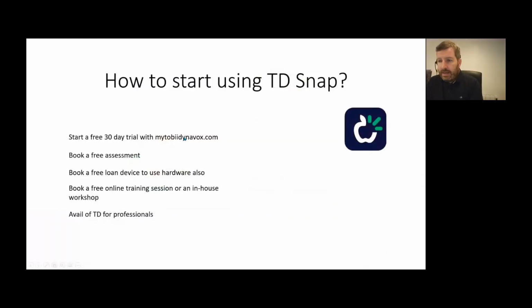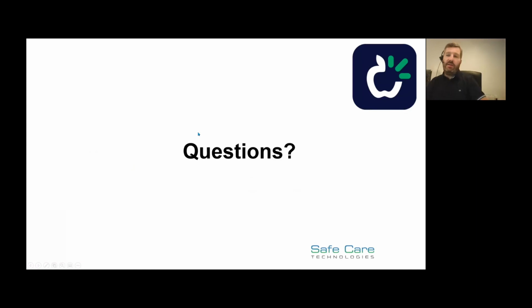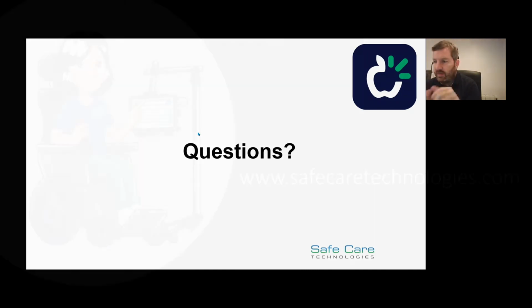So that's pretty much it. A lot of information in a very short period of time. So look, as I said before, follow up with us. We'll do more training with you. We'll come to your school or your center or whatever, and we'll get you up and running, and show you how to implement TD Snap.